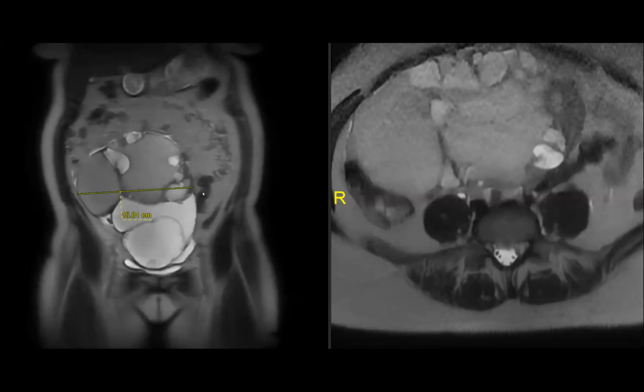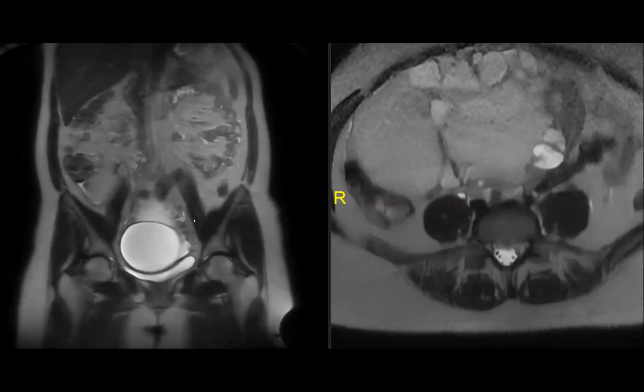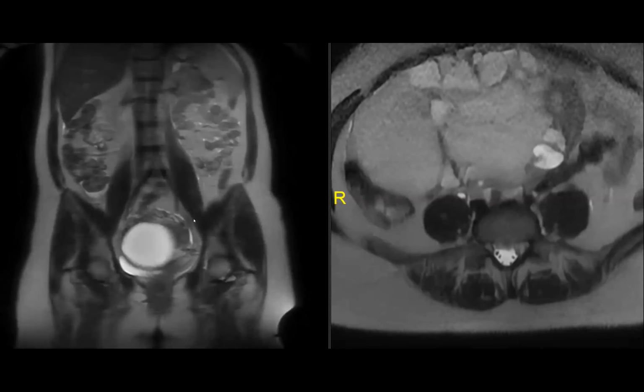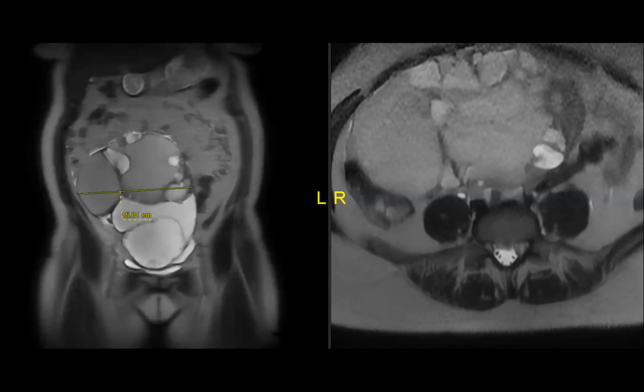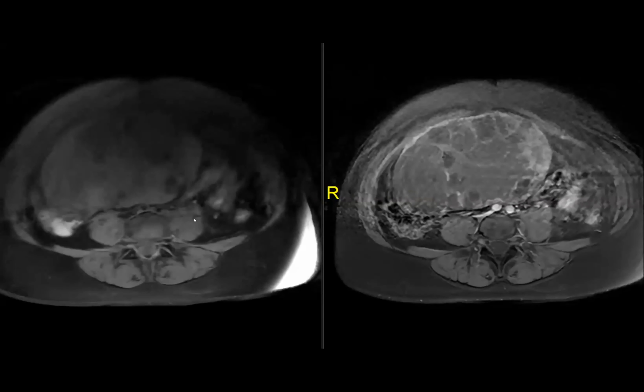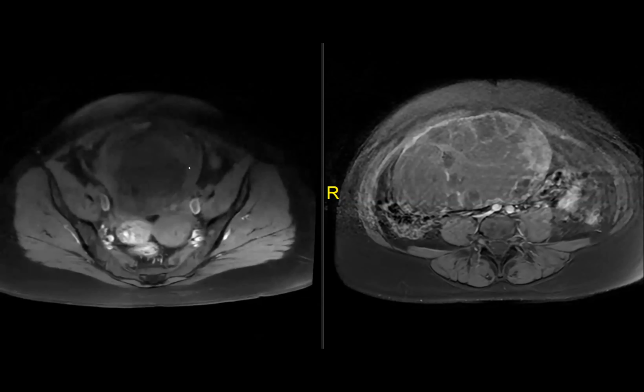I don't think we can see a normal ovary here. But you see why I thought that maybe this is it. Look at these all peripheral, but again, not as exciting as it could have been. So anyway, I think this T2 dark part corresponds to something that we can confirm to be a solid component. There is a relationship between appendix and ovarian mucinous tumor.